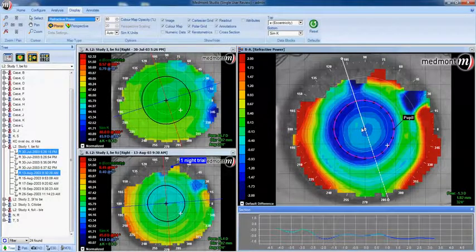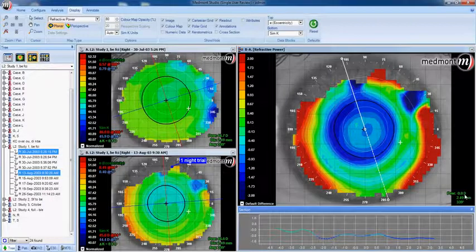The refractive power map is very effective for measuring the treatment zone size. If you take your cursor and drag it to the point where the power difference reaches 0, at this value here, that's the limit of the treatment zone. If that 0 point, or that point where the pre and post cornea show 0 change, that will be the limit of your treatment zone. And if it's beyond the pupil margin, you could expect the patient to have a limited, if any, amount of aberrations or flare and glare from overnight orthokeratology.